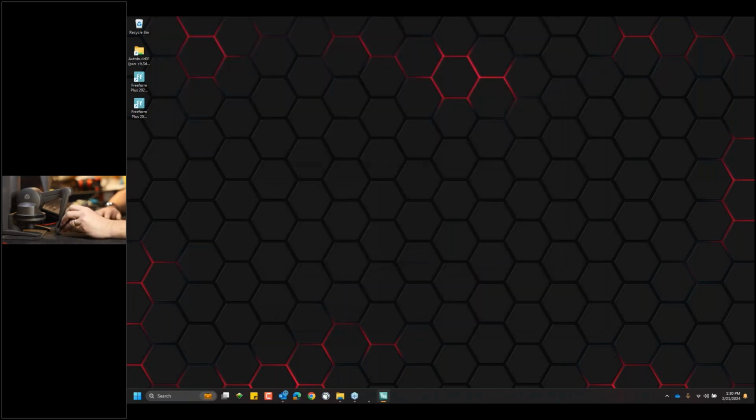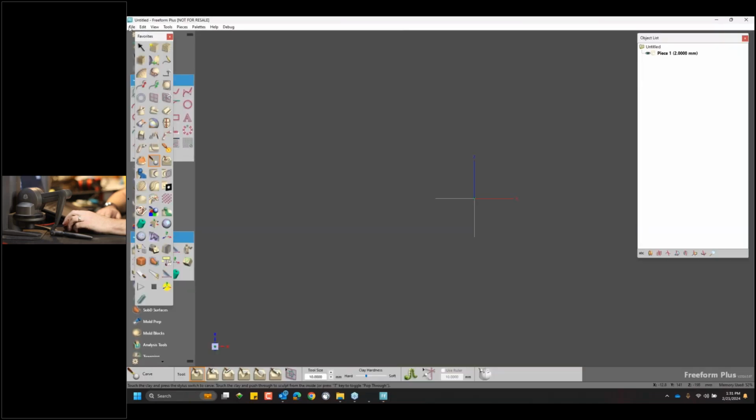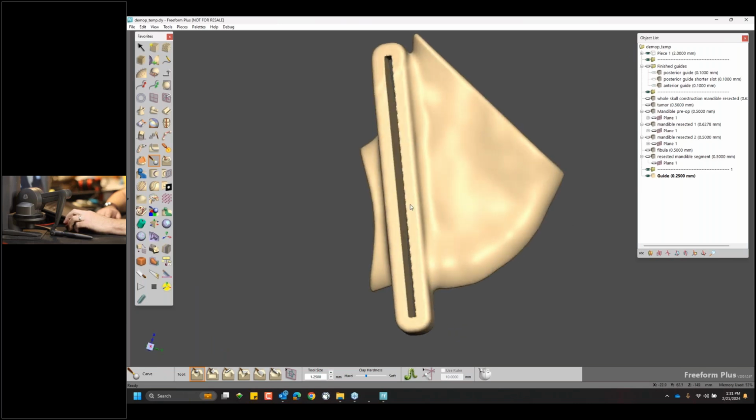The wonder of live demonstration. So I just reconnected and calibrated my device, and now I will launch Freeform once again. And I'm off to the races.